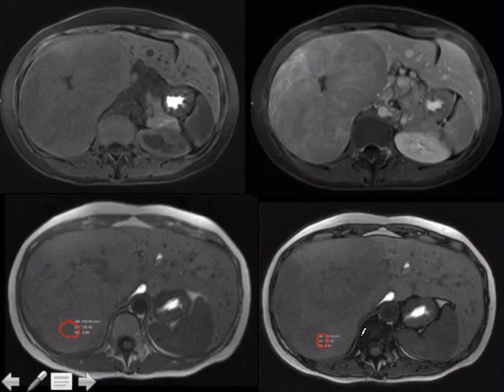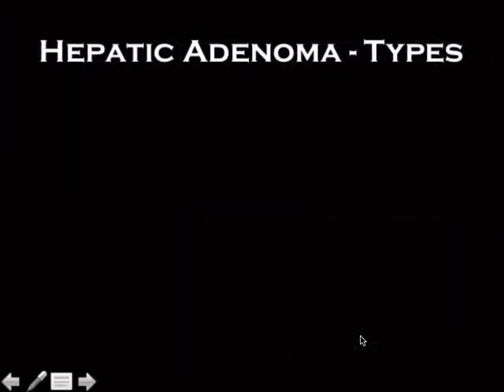So what are your fat questions? Adrenal adenoma, hepatic adenoma, and then focal fat sparing or infiltration. Those are the main four that I would know for abdominal imaging. So can't see the adrenals, and we got a big mass. So if that shows signal dropout, then I'm going to call that hepatic adenoma. That's a classic way to show that.